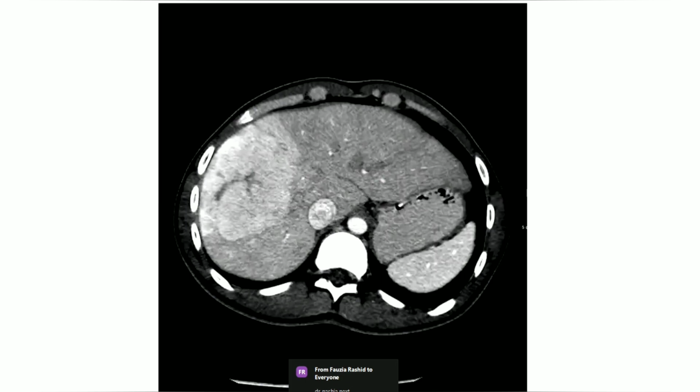liver carcinoma, because I have no arterial images, so I can't appreciate on this that this is early portovenous phase of the liver. So it is enhancing, so this is a liver carcinoma.